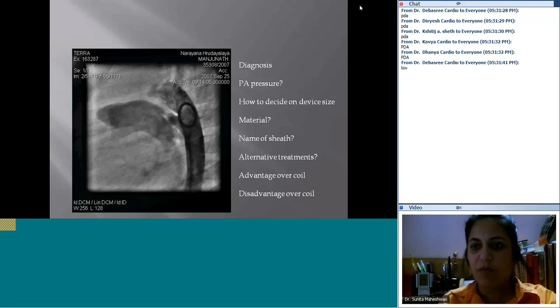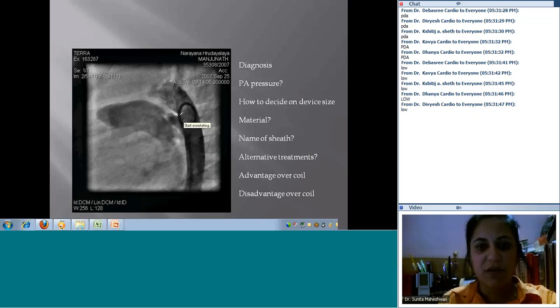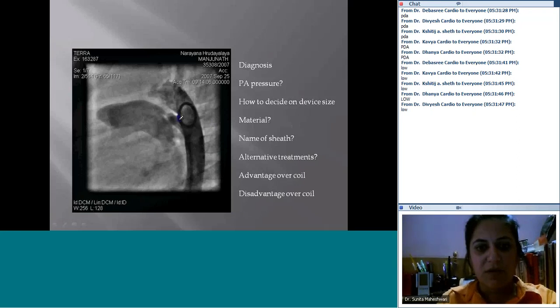Pressure is low, right? So everybody can see there's a restriction. It's going right where it enters the pulmonary artery. And even on your echo, the exact narrowest point of your PDA is always where it enters the pulmonary artery. A lot of people actually measure the ampulla. You can see here, I'm just going to annotate for the first year fellows. This is your ampulla. This point here is the narrowest point of the PDA where it enters into the pulmonary artery.